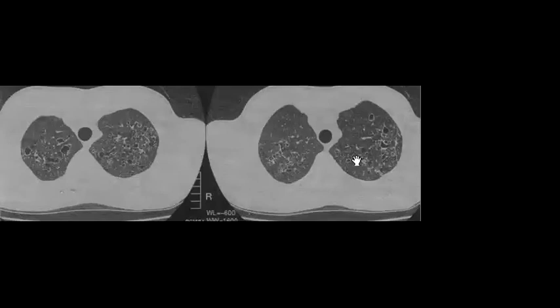Finally, in this case, when he did CT for his lung, or you check the system for the previous images, you check that this patient did CT for another reason, and you find this appearance. So how do you describe it? Exactly.